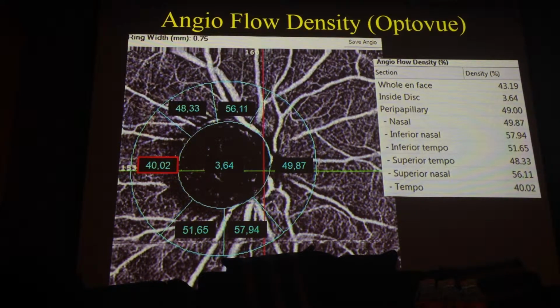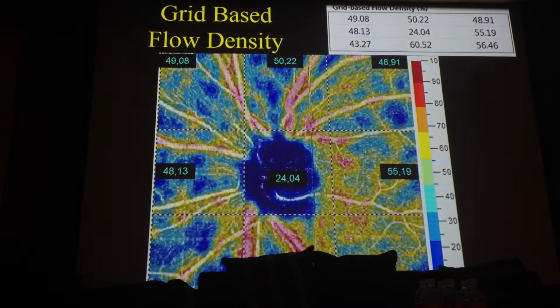Today, for optic nerve follow-up, we can use a few tools, and these tools are proposed by OptoVue at this time. The other competitors in OCT angiography do not yet have software dedicated to the optic nerve, but we saw yesterday that all these tools are very powerful in quantification of glaucoma disease and in neuro-ophthalmology. This way of presenting the results will probably be improved by using a larger surface of analysis around the disc, and you have seen this kind of map.